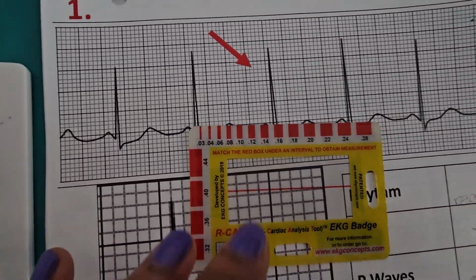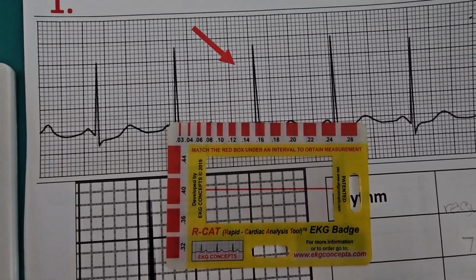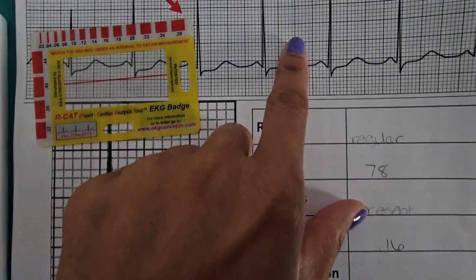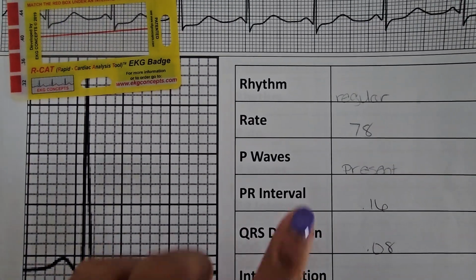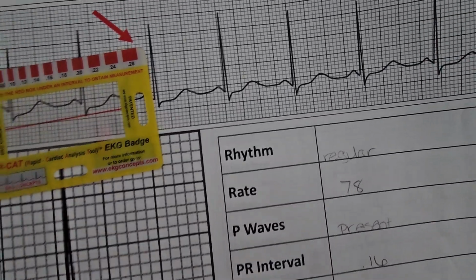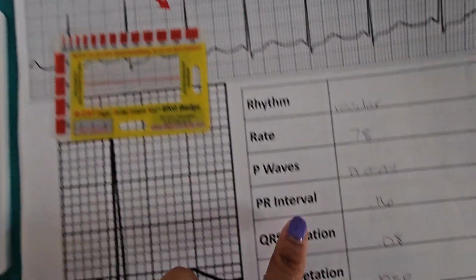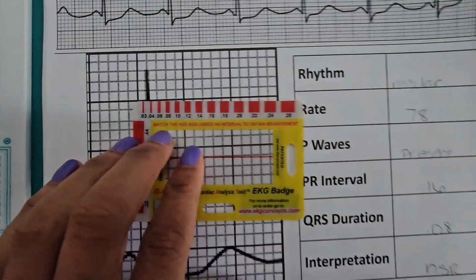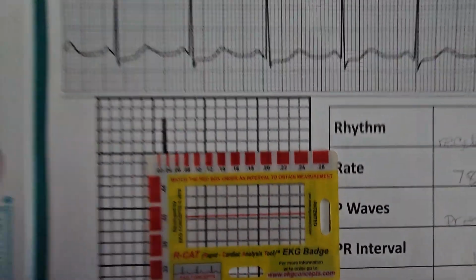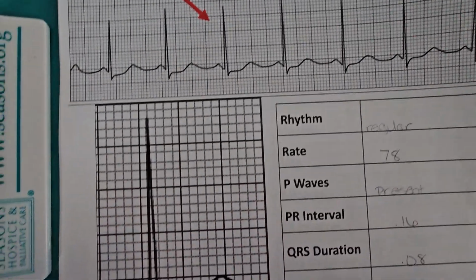So anyway, these boxes up here are usually good for measuring your PR intervals and your QRS intervals, your duration. So you have your P waves. Well, that's just to say, yeah, we have a P wave here. But you're going to measure your PR interval and you're going to measure your QRS duration. And if they say, hey, you want to measure your QT, you'll also have that. Because I know that the regular PR interval is 0.12 to 0.20, I always start at 0.12. And on this particular practice sheet, it actually has the arrow of what they want you to measure, and it's actually blown up down here.